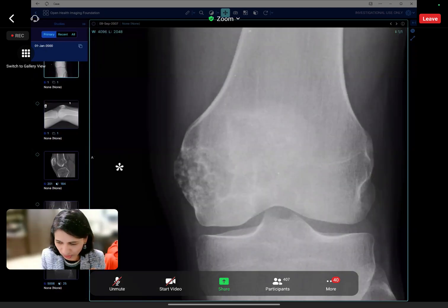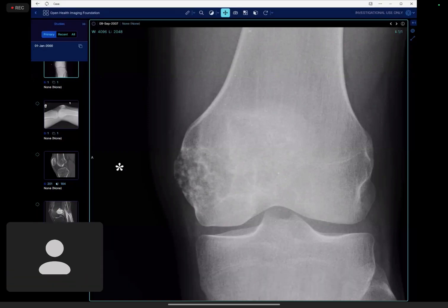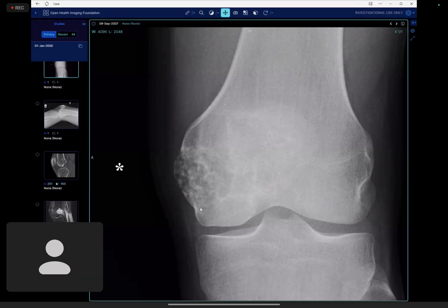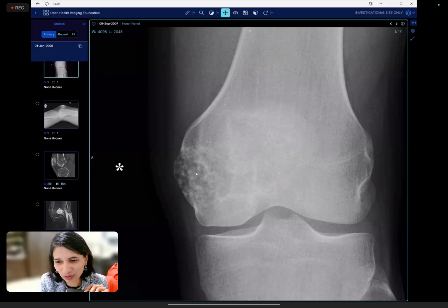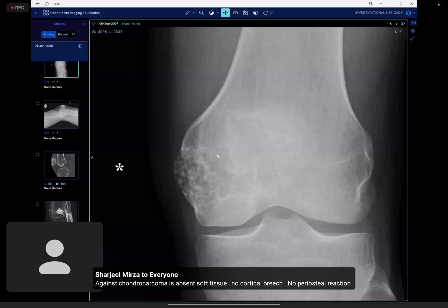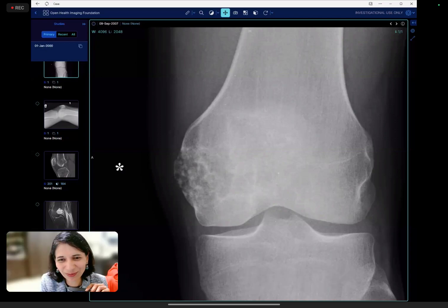Any questions on those lesions or those cases? Sorry, in this particular image, if I say only chondroblastoma, do I have to give differentials or just say it is a chondroblastoma? I think it's very difficult, just because the chondroid calcification is there, and it's epiphyseal. It's a young patient. So then you narrowed it down a lot.